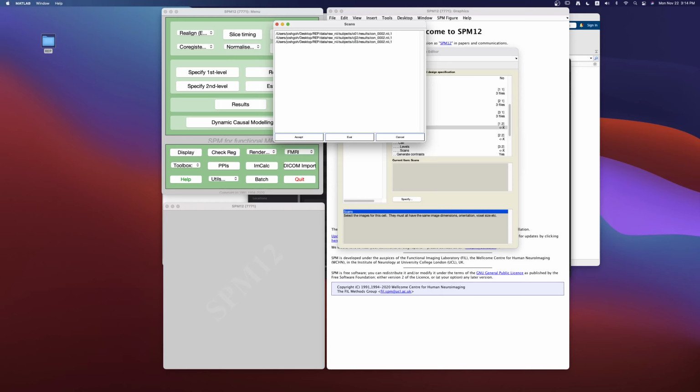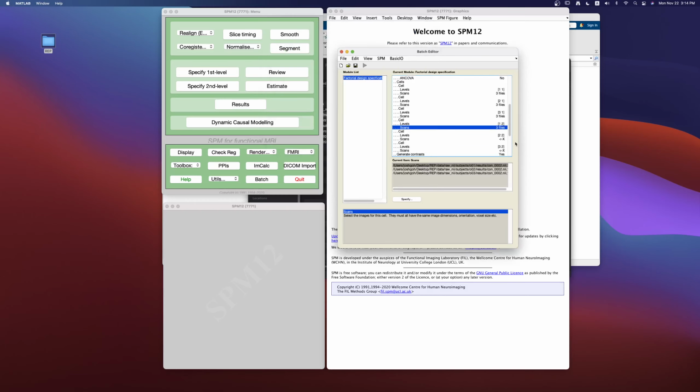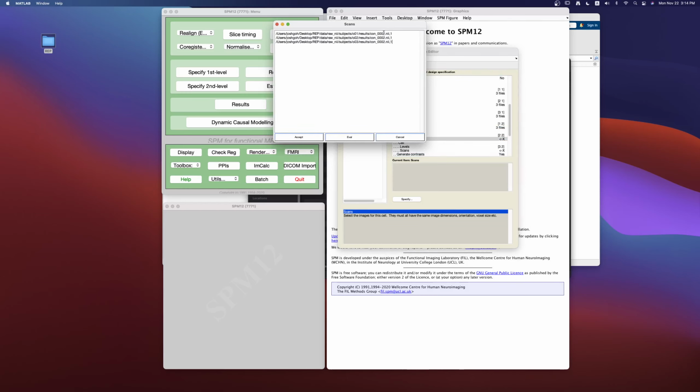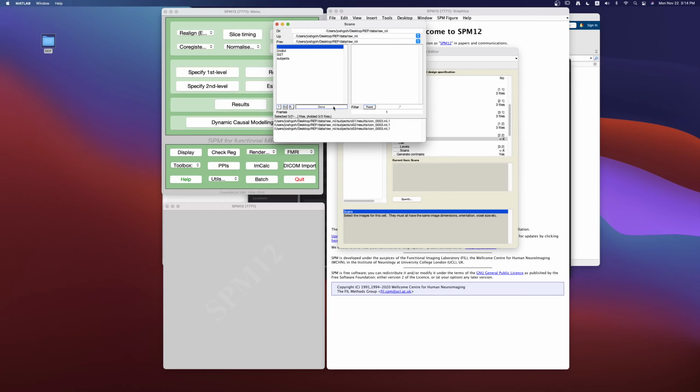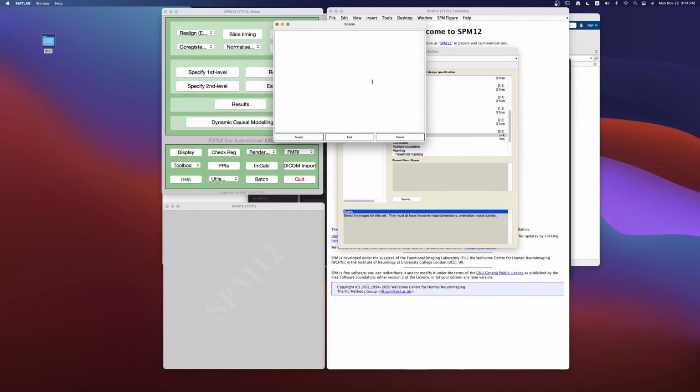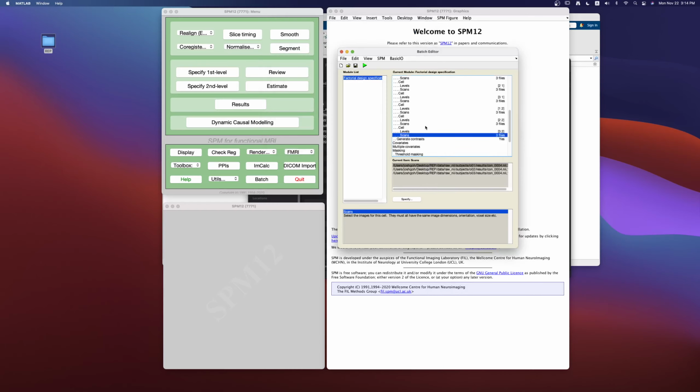All right, and I'm going to copy this, and then fill this up to be for the P32 condition for the old, and finally for the P33 condition for the old, which is contrast 004. Okay, so that's it. Second level has been set up. Okay, really quick, really easy.